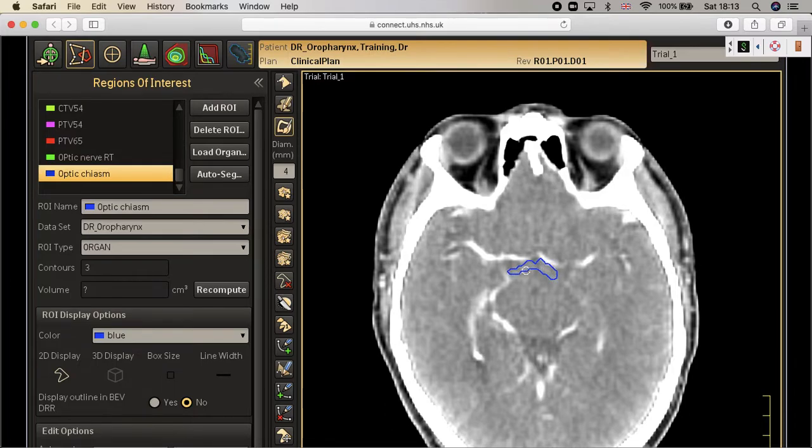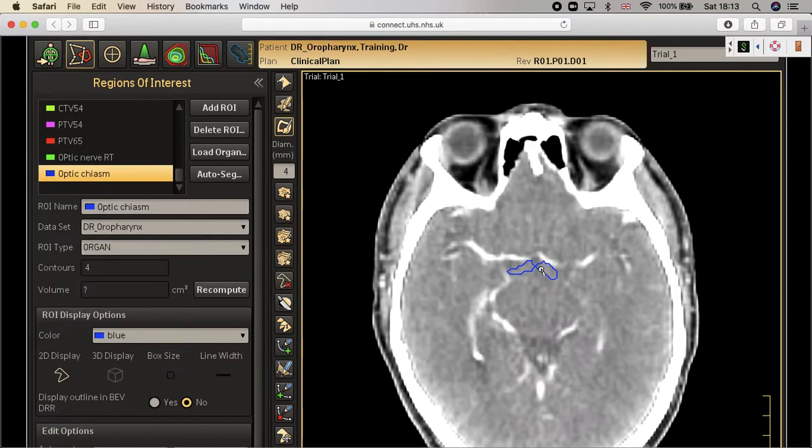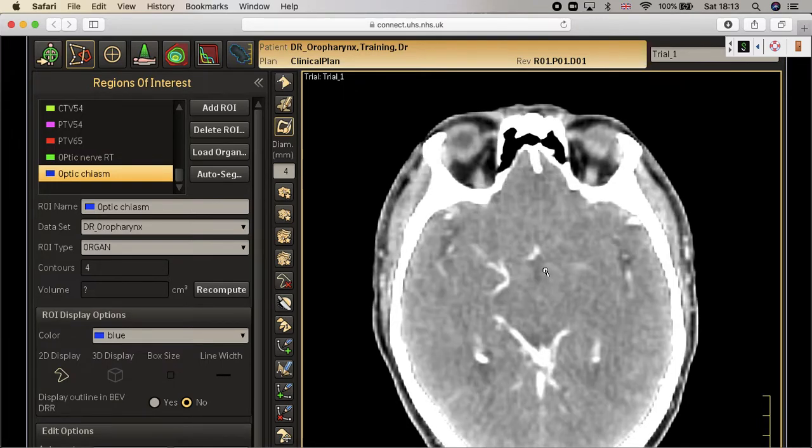And this is easily seen as, you can say, like an ear on either side. So this is the optic tract. So if you put here the body, go up with the arrow up, this is the optic tract. I'm sure about it, and I'm drawing it. Sometimes you see the optic tract in two cuts, which is fine.